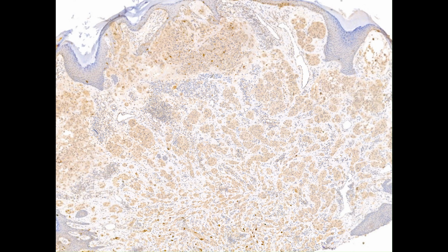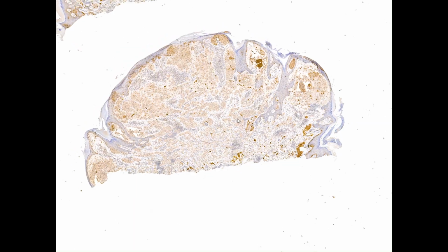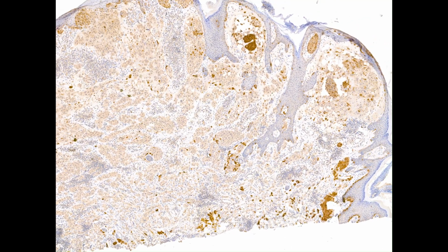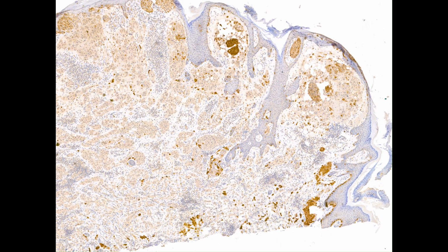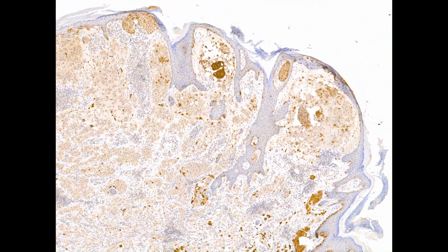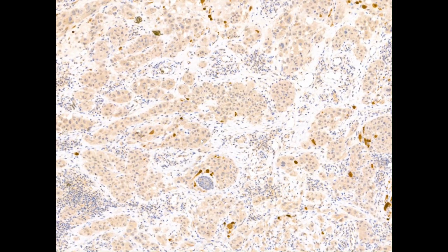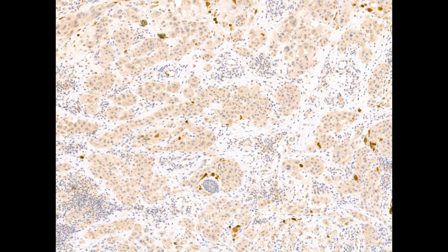We have a PRAME immunostain that shows a lot of positivity. Actually, I misspoke. This is a p16 immunostain. And so you can see that it's showing us two cellular patterns. First, we have the fascicles of Spitz melanocytes with retained expression. So these are presumably remnants of pre-existent gene fusion Spitz nevus. And then you can see concurrently that the vast majority of the tumor shows p16 expression loss and represents Spitz melanocytoma. And then the last stain is PRAME.